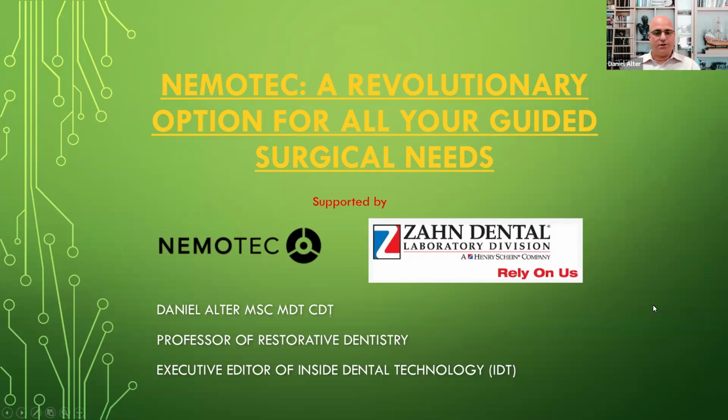And if you're currently a laboratory that is providing surgical guides, I would encourage you to look at this because it does make things significantly more seamless, as well as allows you to do some tremendous things. Notably the stackable guides. So you can do a stackable guide from the very conception with the DICOM file all the way to the finalized case.